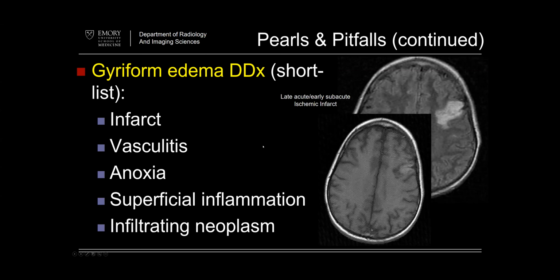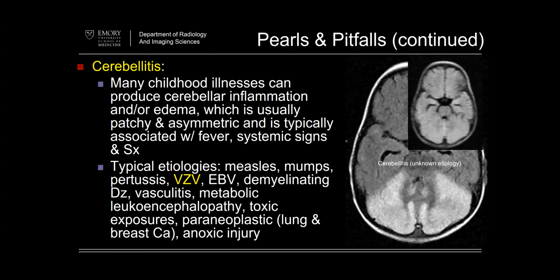So again, short interval follow-up to resolution of abnormal enhancement can be very helpful to make sure it's not something more sinister. And generally, Elster's rule of threes helps you remember when to do it. Enhancement of subacute infarct as early as 3 days, maximum at 3 weeks, gone by 3 months. Then try to get people to wait 3 months, if the clinical situation allows.